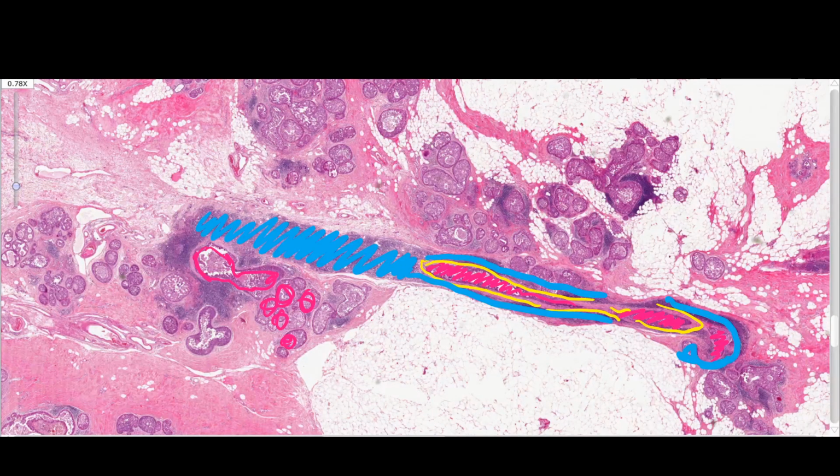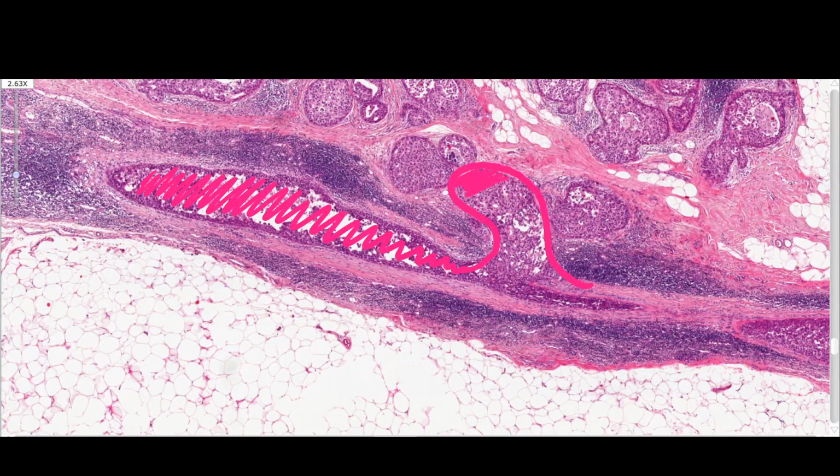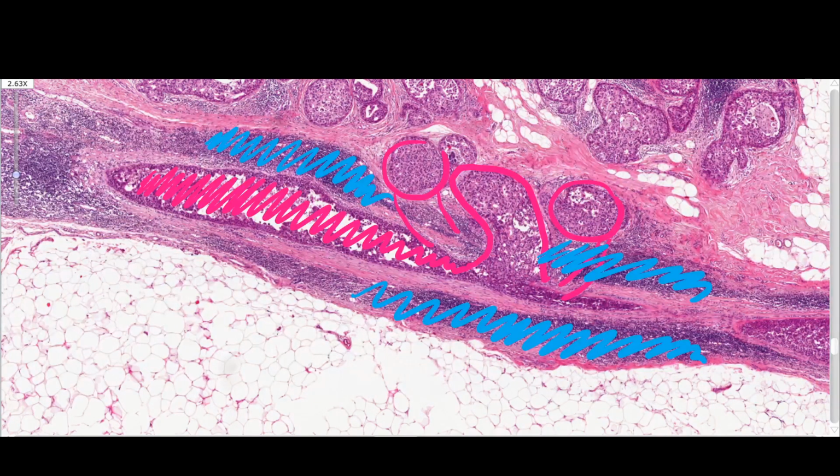All the histopathologic features of neoduct genesis are right in front of you, but we are going to magnify this duct because it's super interesting. First of all, the cancer cells in the middle. Then a very thick layer of desmoplastic reaction and lymphocytic infiltration. But this is what I wanted to share with you. Do you see that the cancer cells, from within the major lactiferous duct, break themselves through the basement membrane and form a new duct, neoduct? Let me take it away, and then you see that not only this, but beside it and beside it, there are these cross-sections and longitudinal section of neoduct genesis. Of course, the thick periductal lymphocytic infiltration follows all these.